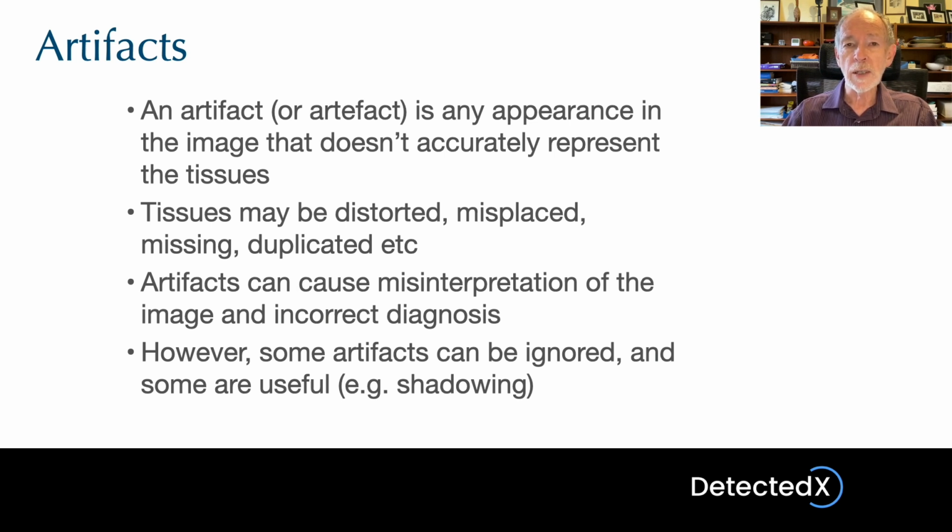Now, artifacts can at times cause misinterpretation of the image and therefore the potential for incorrect diagnosis. Obviously, we want to avoid this, and so it's important that you learn to recognize the major image artifacts, to know how to check that they are in fact artifacts, and perhaps how to minimize them if necessary. However, some artifacts are relatively unimportant and can simply be ignored, and some artifacts, such as shadowing, are actually diagnostically useful.